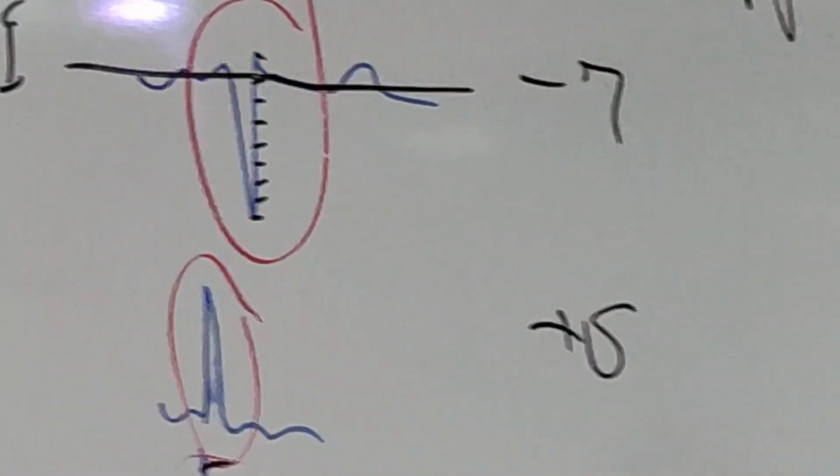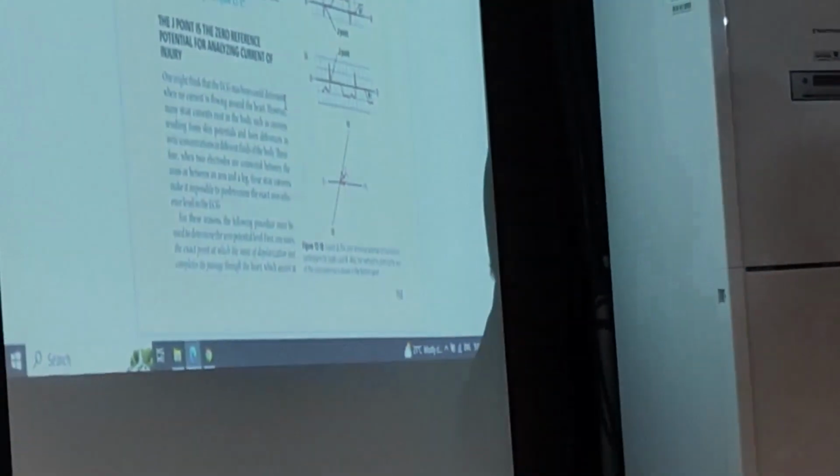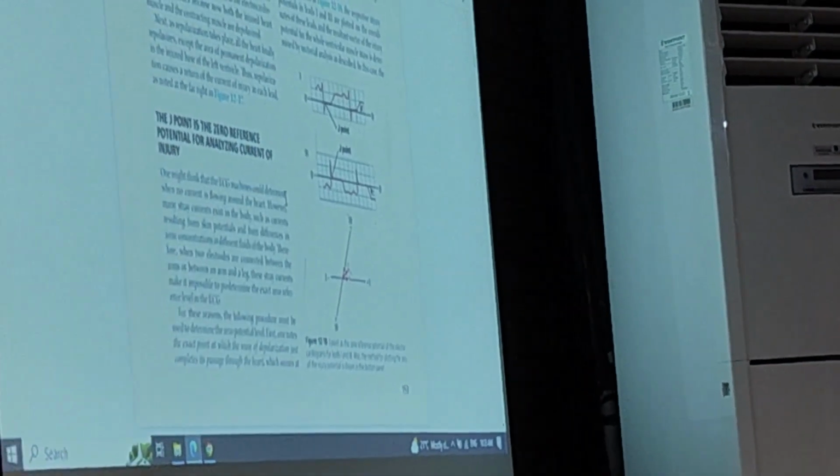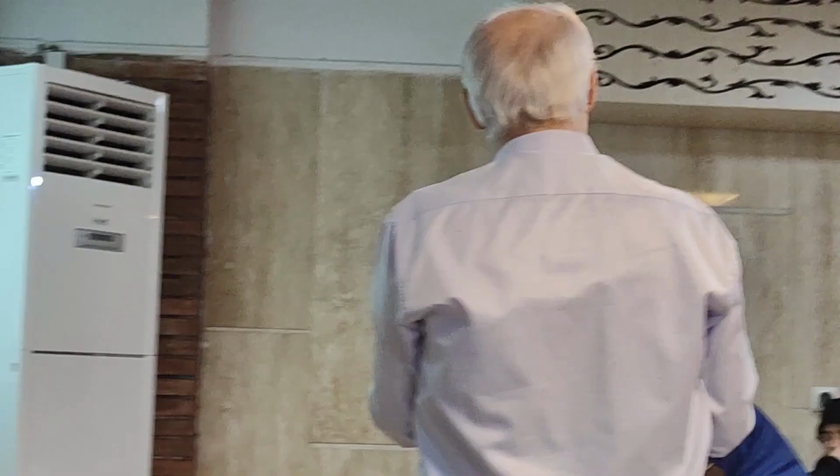Now from this ECG, by interpreting, by depicting the depolarized area vector and making the resultant vector, I can easily guess which part of the right or left ventricle is infarcted.